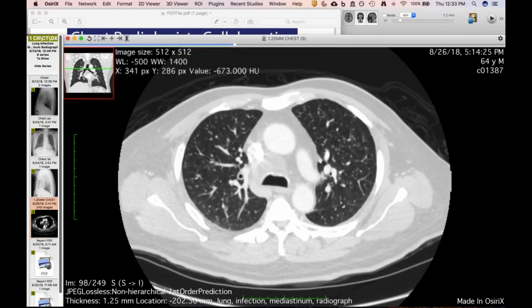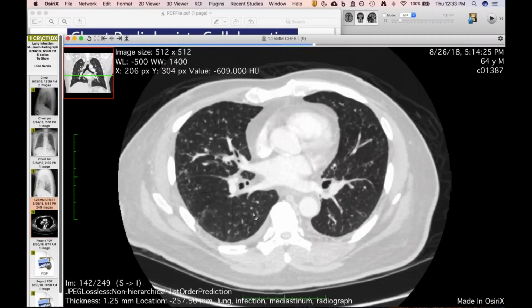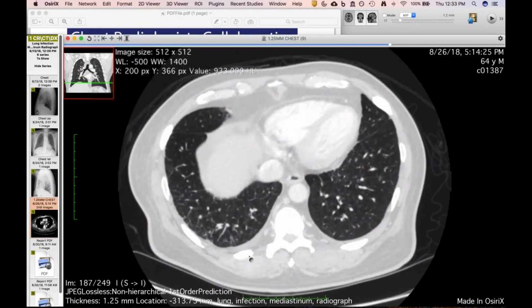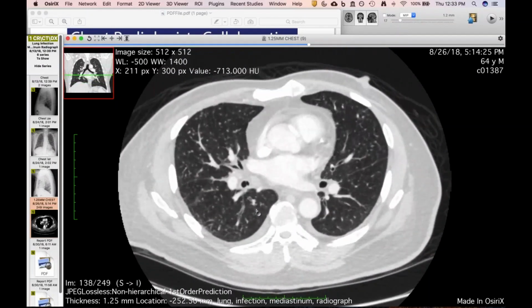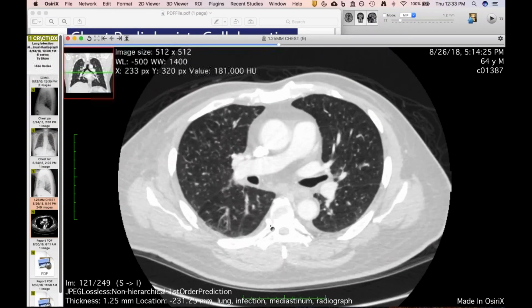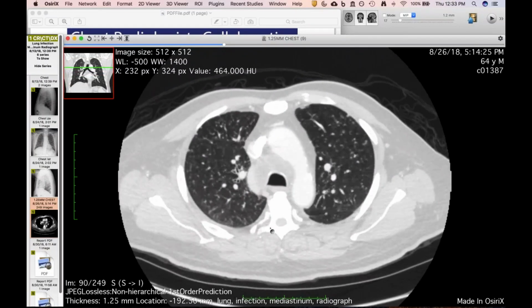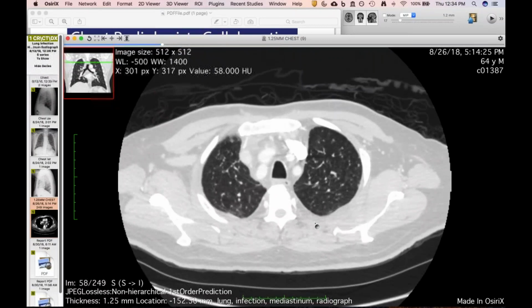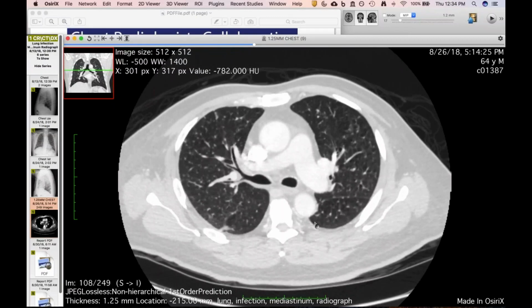And without seeing a more discrete area of consolidation, like we typically think of as the focus of infection, you think of miliary as being only in the bloodstream, but I guess it's then seeping out into the airways as well, because there's not really a place where I can say clearly this is the site of airway centered infection. I don't know, what's everyone's experience with positive sputa in patients with miliary disease? In my experience, the yield is lower, and same with bronchoscopy, but it's not zero. So yeah, I like your theory of it seeping out.